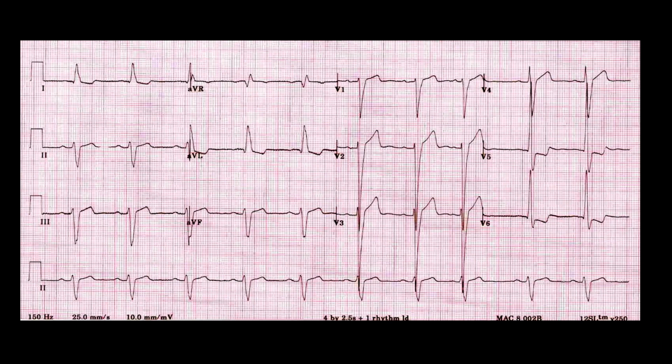I screen this for ischemic changes and I go, oh man, I see some ST depression at V5, V6. I look up at V1 and V2, especially in V2 and actually V3. If I look close, I see I have about 2 or 3 millimeters of ST elevation, which might make you think, hey, I've got a STEMI. But again, my QRS is wide, the QRS is down, the ST segment is up, and it's going with the T wave.